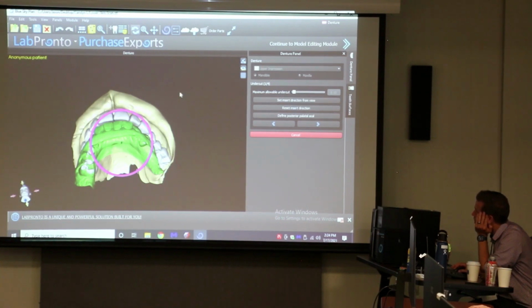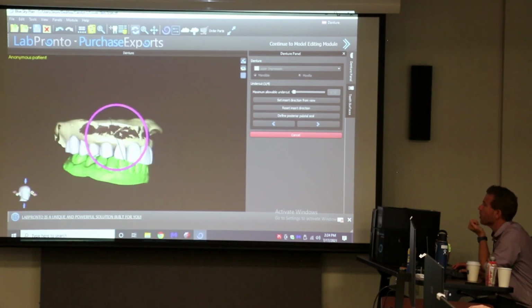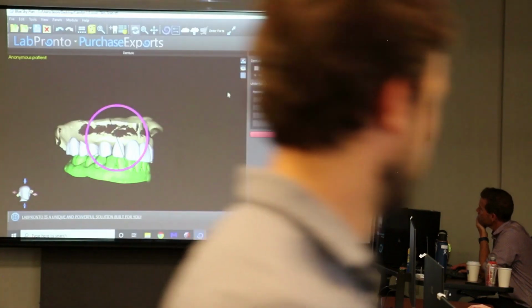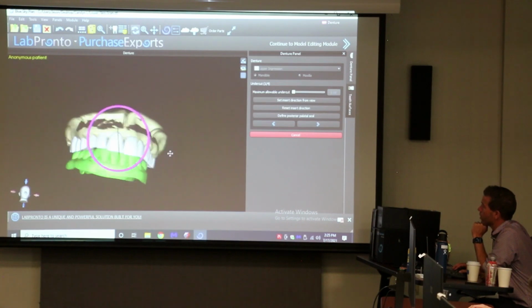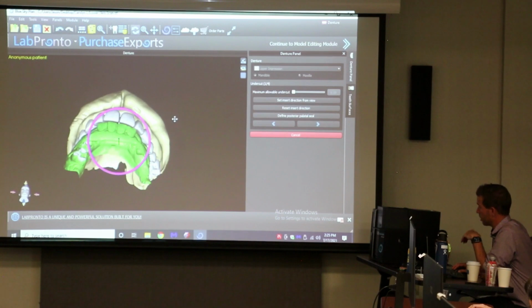And now those undercuts got changed where there's a little bit of undercut. So the software is making dark brown all areas of undercut. Let's just say I don't want any. If I just go to 0, it's going to block out all the undercuts.